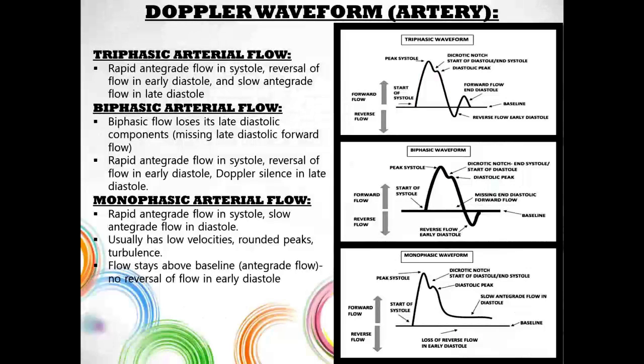We also talk about the pattern of arterial flow: triphasic, biphasic, and monophasic.